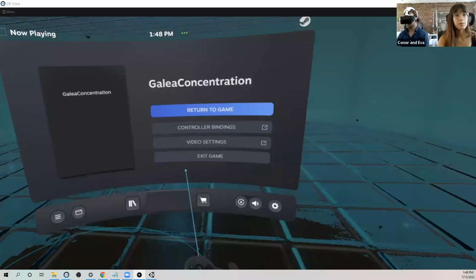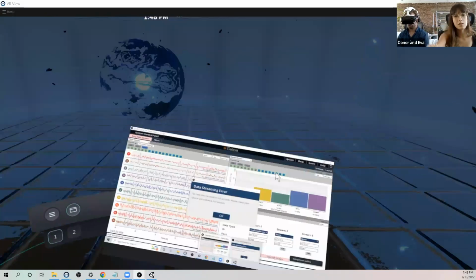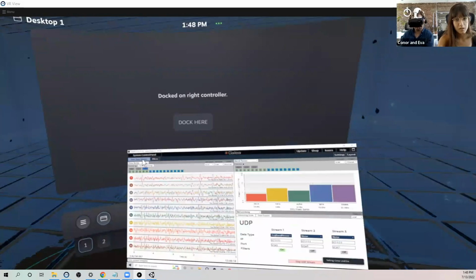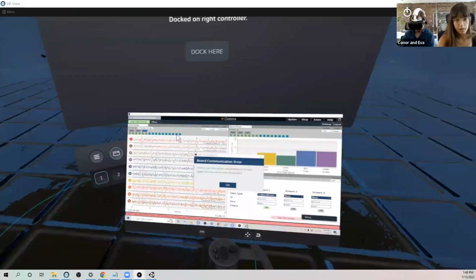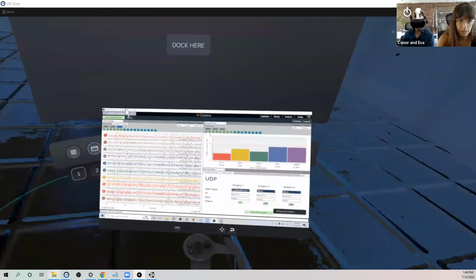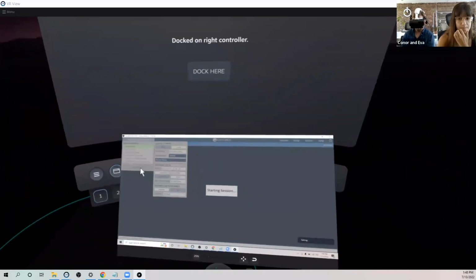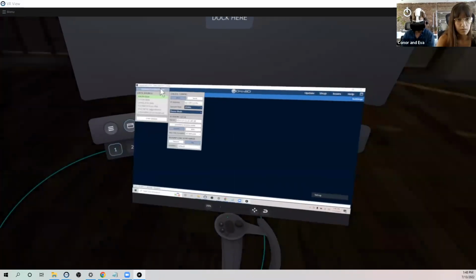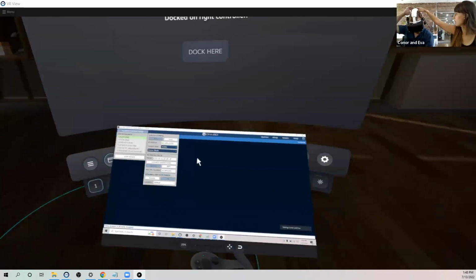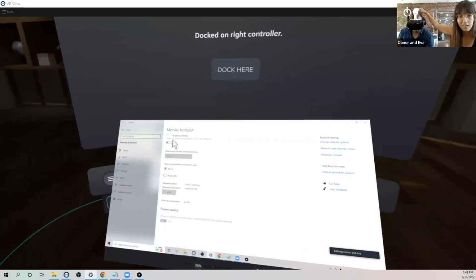How do I get the thing mounted? Controller bindings? You first need to open the desktop. Yeah. And now it's the next one. Oh, we stopped streaming. Oh no, we've got to do a hard reset. Let me try to stop it and restart again. Try to disconnect the GUI first. Oh, stop the stream. I'm going to do a hard reset. I can do it, one sec. We are stressing our computer pretty hard at the moment. Yeah, streaming VR.